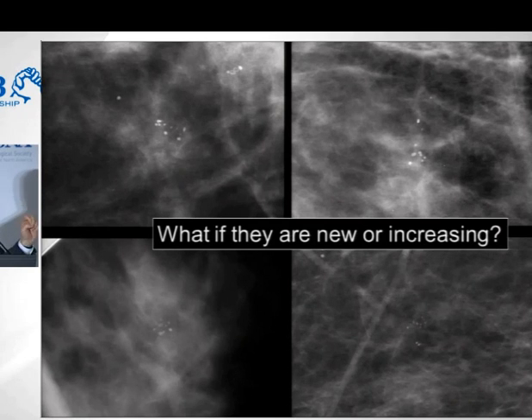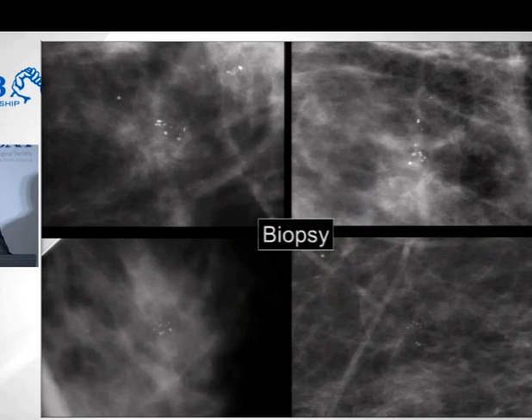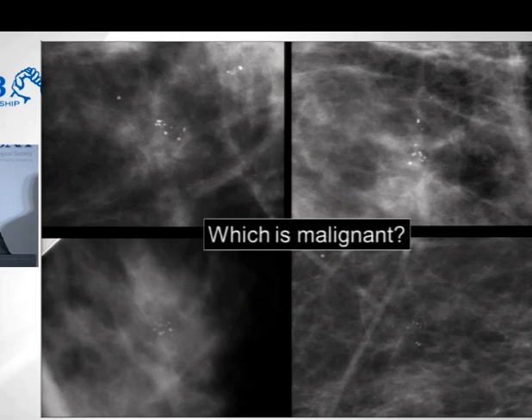But what if you find old films on these patients? These are 4 separate patients. What if you find old films and you realize that these calcifications are new or increasing? Same calcifications, they look exactly the same. In that circumstance, you turn to the rule book, and the rule book is very clear. If these calcifications are new or increasing, those same calcifications need a biopsy. And I can tell you, in each of these 4 circumstances, these were new or increasing.